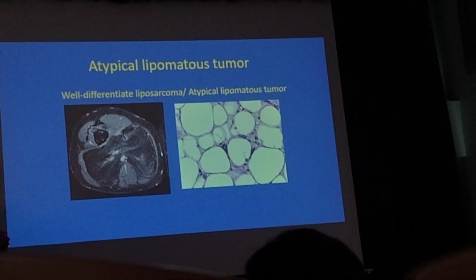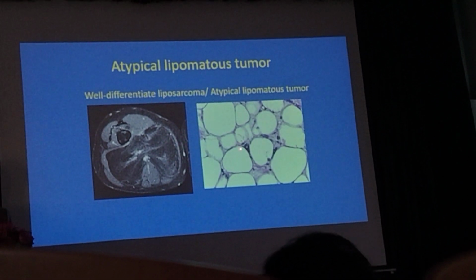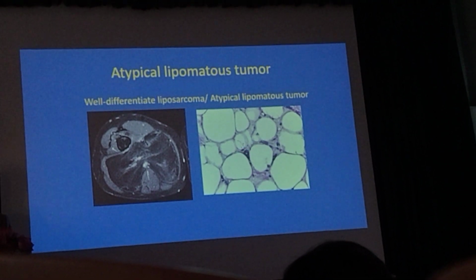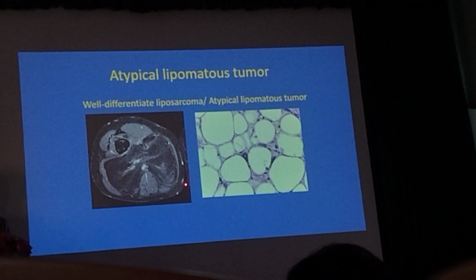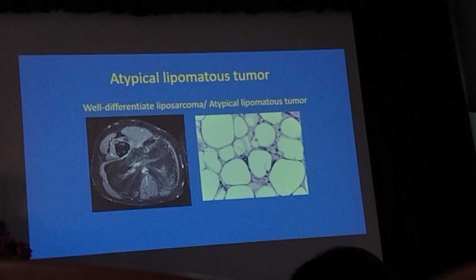Okay, and this is the pathology that corresponds to this one. You have fat cells, and this is the non-fat cell, which is the atypical lipomatous cell. On pathology, there is a mixture of normal fat cells and atypical fat cells that make up this tumor.